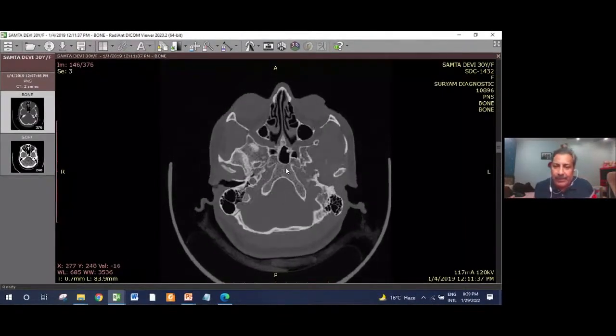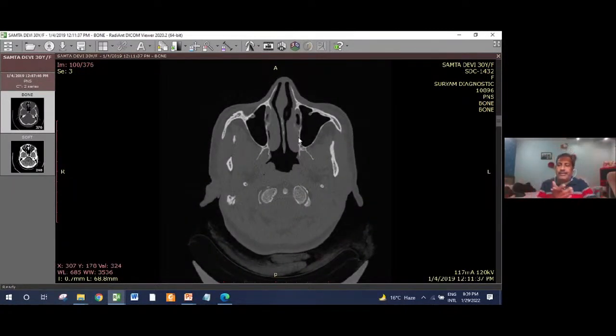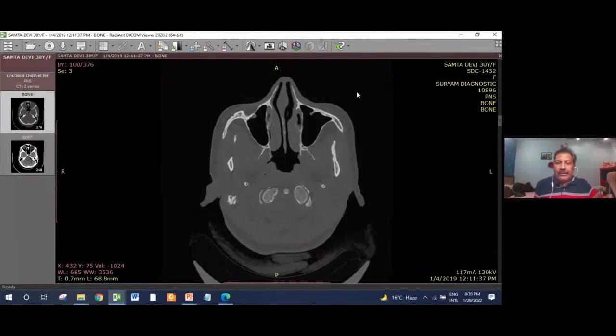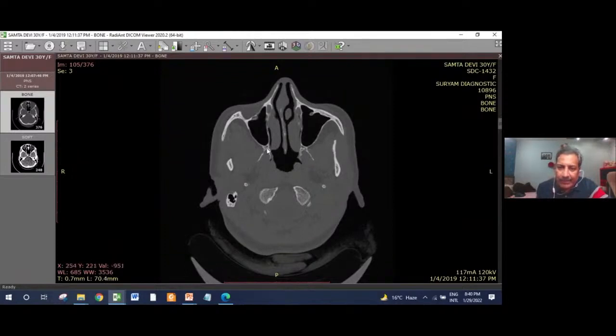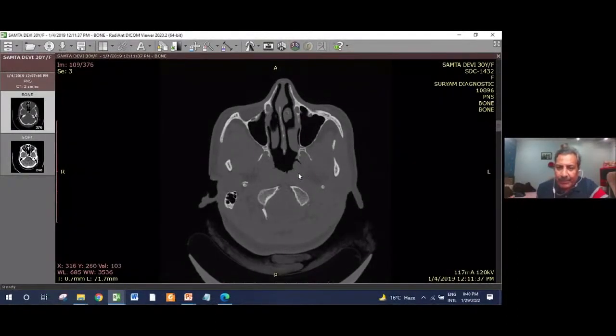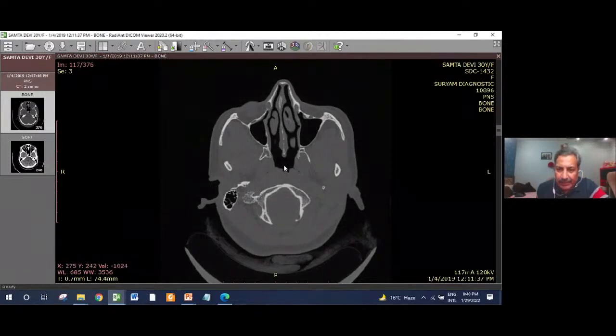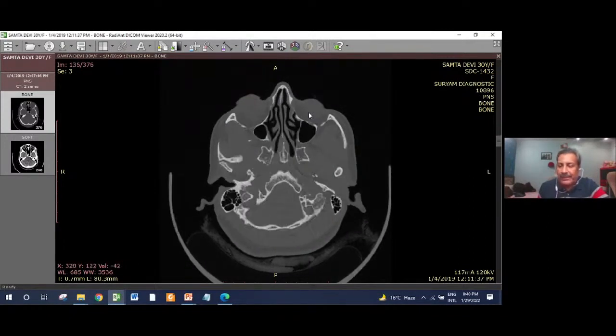Then the information about the nasopharynx, eustachian tube, the pterygoids, particularly when you deal with tumors like JNAs, the axial plane gives more information. This is the pterygopalatine fossa, a relatively collapsed fossa, that's the pterygomaxillary fissure, that's the infratemporal fossa on both sides, that's the eustachian tube torus. See the torus of the eustachian tube, and that is the eustachian tube opening. Behind that is the fossa of Rosenmuller. That's the nasopharyngeal lymphoid tissue. So a lot of information is best ascertained in the axial plane.